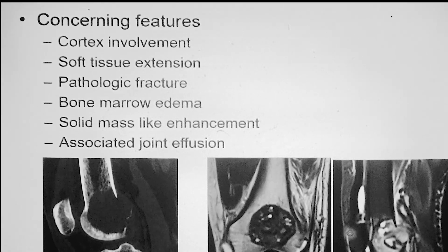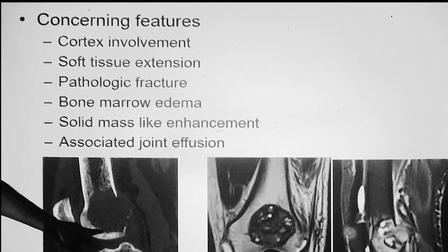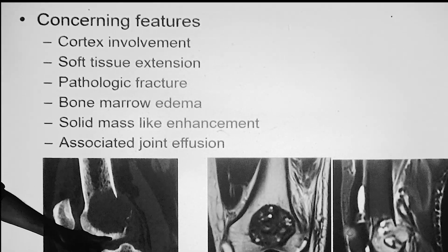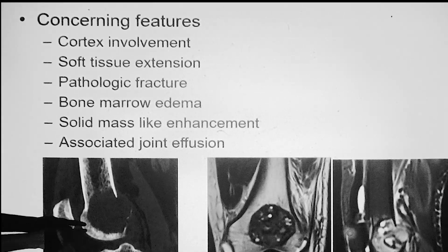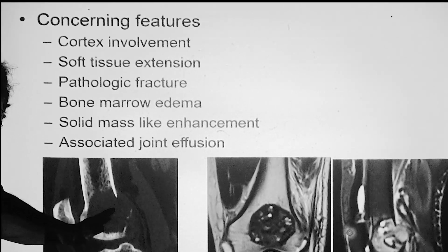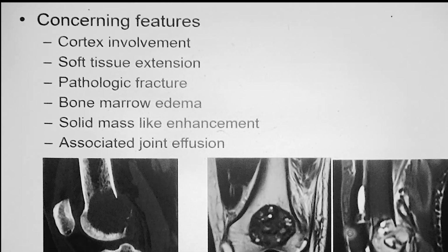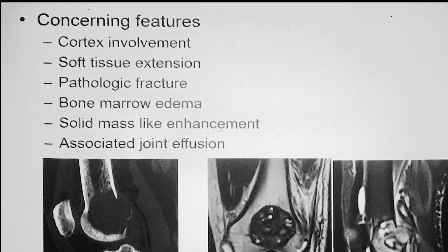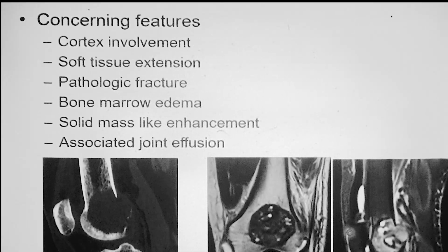The first time I saw this, I thought one thing, but when I saw this one, I changed my diagnosis because it is almost involving the epiphysis. The thinning of the cortex and pushing of the tumor is also one of the findings of a giant cell tumor. It is actually epiphyseal, but the notch suggests it is in the metaphysis.